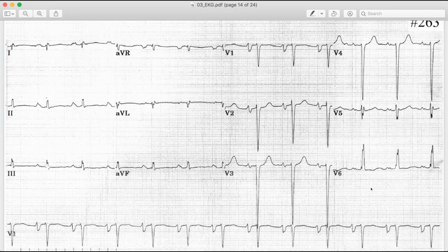Okay. Anything else? Maybe the person is obese, seeing that we have a low voltage. Possible, yes, it can be. And what's interesting are the biphasic P waves, as we have seen in V2 and as with the left atrial enlargement in V1. That's the left atrial enlargement. That's it. Nothing more. Don't try to find more. Okay, thank you.